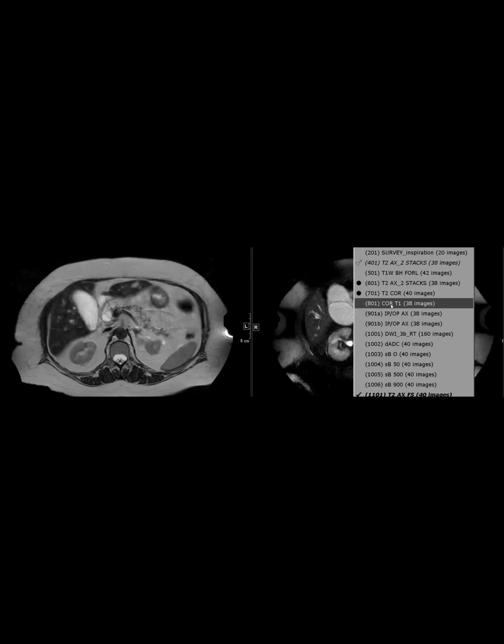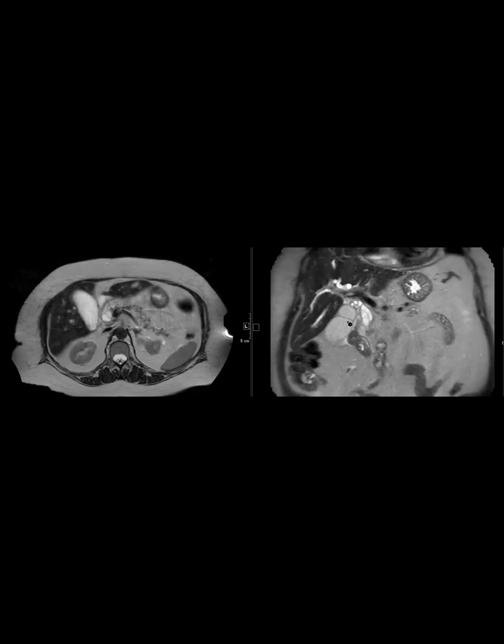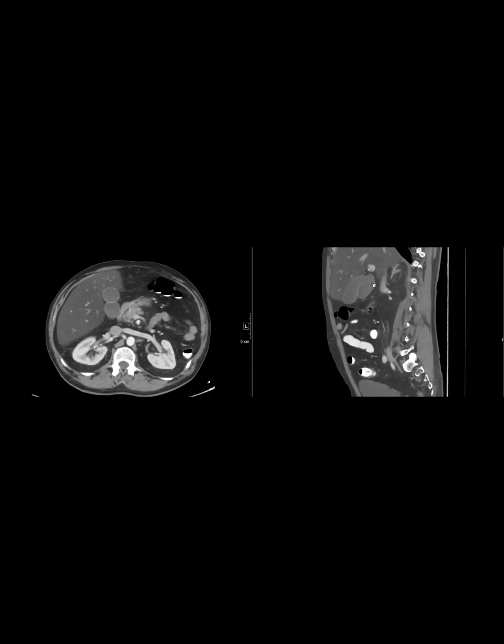because I think the sagittal is super easy. On coronal, you sort of see it, but you have to reconstruct this from axial and coronal. But I think the sagittal here is just so right there in your face.